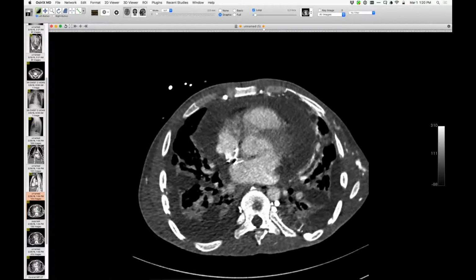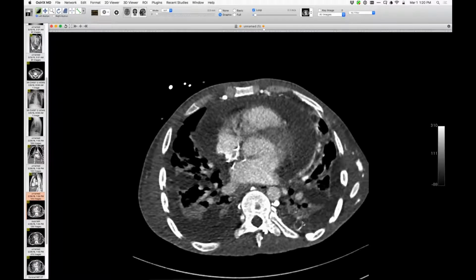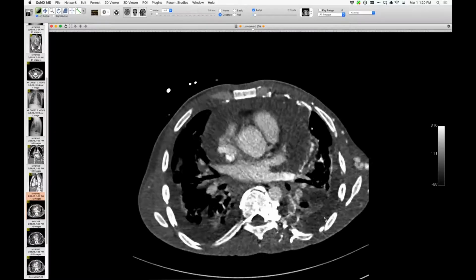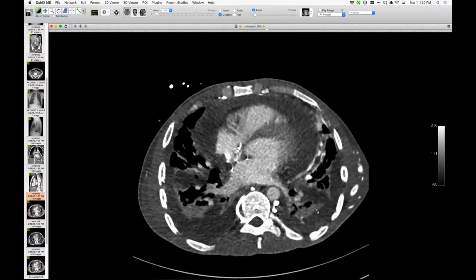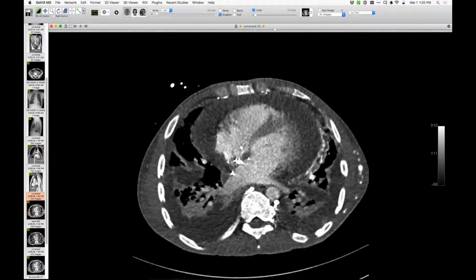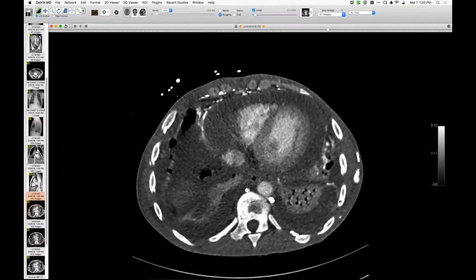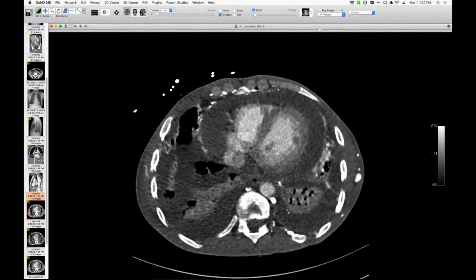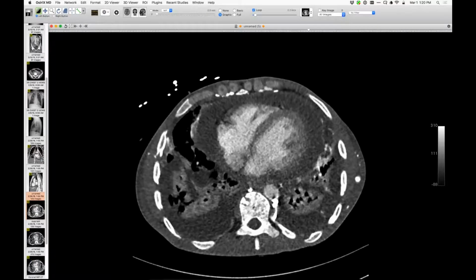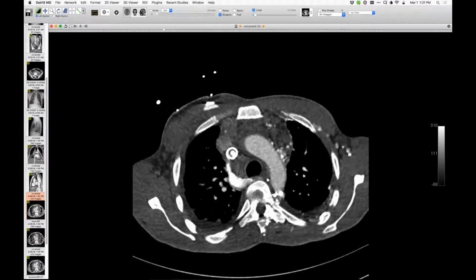Look at these crazy things. Look at the one right there, going right through the pleural space into the lung. And then these veins down here are relatively bright with contrast medium, having been fed by all these vessels here. Right there. So a pretty dramatic demonstration of that particular pathway. Wow.